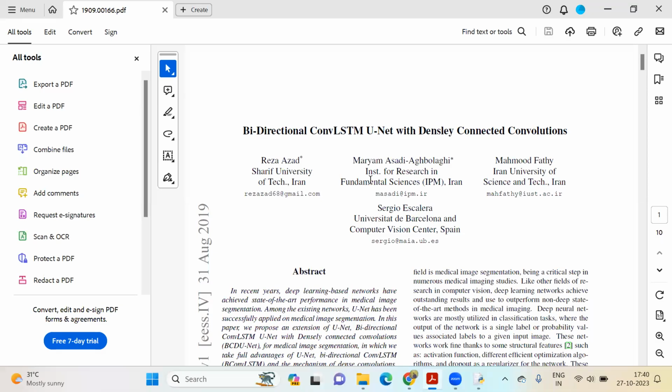Hello everyone. So today we'll see the project: a convolutional neural network based Unet model. Using this Unet model, we are going to do lung image segmentation. Unet is nothing but one of the convolutional neural networks, specially designed for biomedical image segmentation.